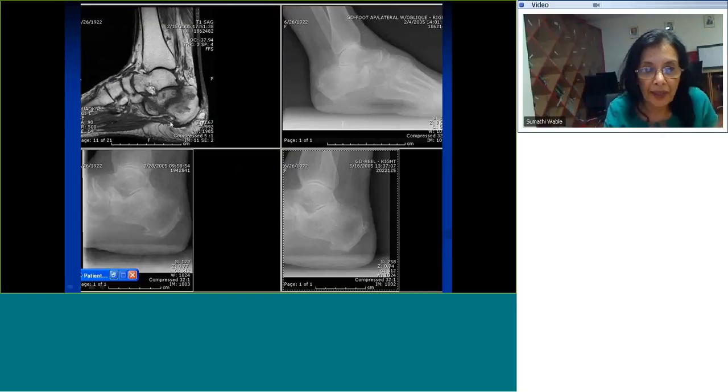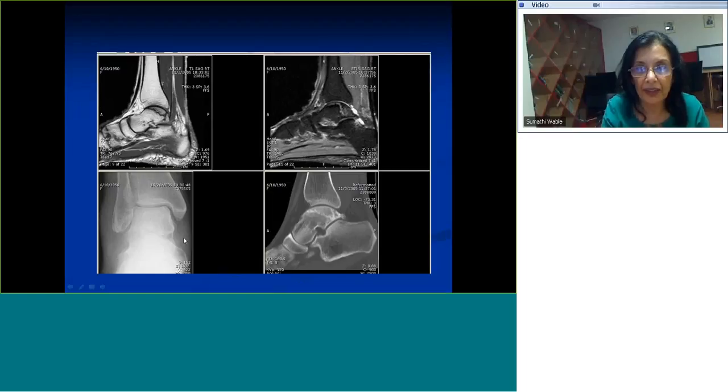Again, the same patient here. You see the same patient on the plain radiograph with very subtle, questionable sclerosis in March. However, two months later, the sclerosis is slightly more prominent. However, there is no question on the MRI that there is definitely an insufficiency fracture.